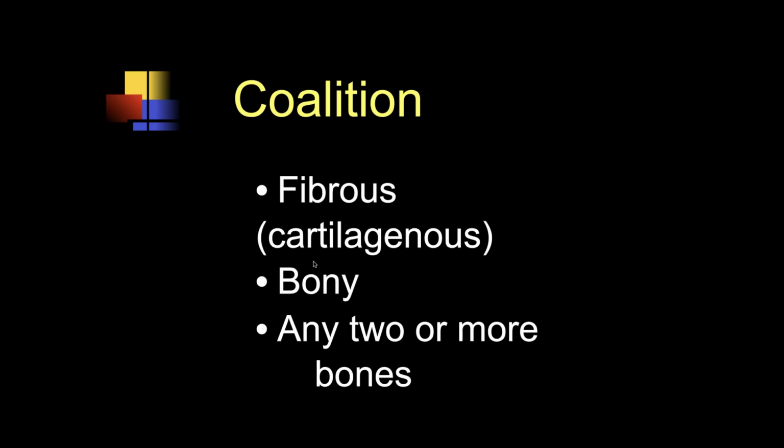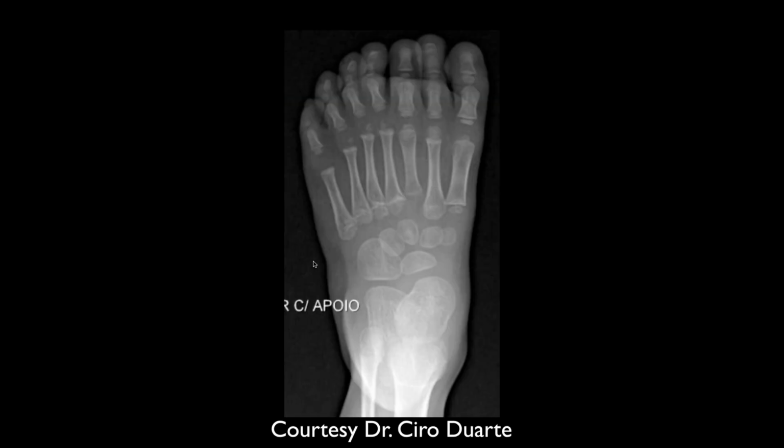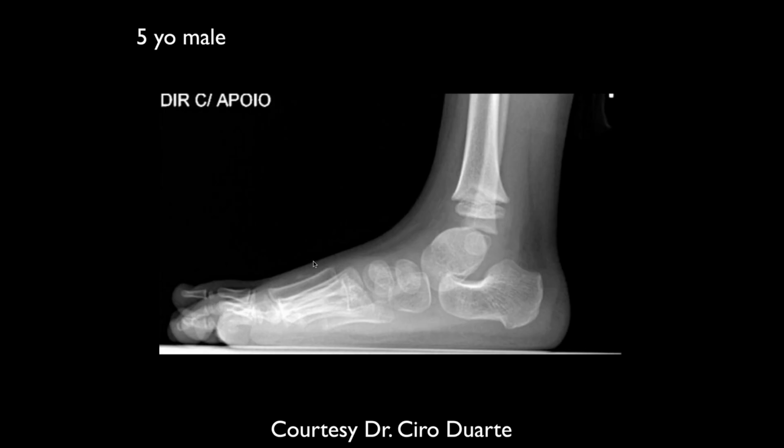But it almost looks like there is a vertical talus too, almost a vertical talus. I think there is, plus or minus. Obviously, yes, it's a flat foot, but that talus is a little, I think it's abnormal. I agree.